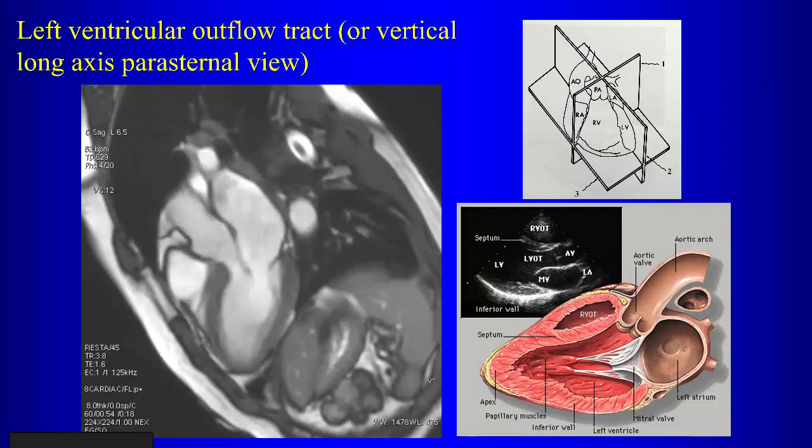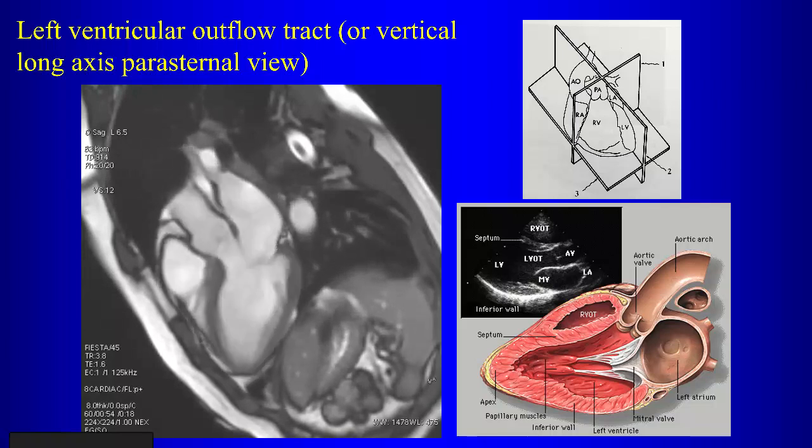The pulmonary vein. We're looking at the left ventricle, right? We don't care about the pulmonary vein if you're looking at the left ventricle. What are the 3 points that determine the plane for a left ventricular outflow tract view? Not the left. No, not the left. Not quite the left atrium. What specific point?